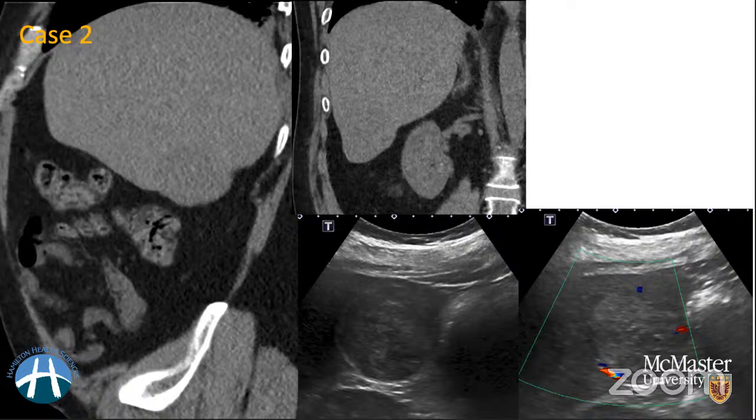And it is really important that you recommend the right next step to ensure that you have evaluated the abnormality correctly. So in this particular examination, we gave a bunch of differentials. We were not able to further characterize this based on this imaging. And the next right step to go forward is to perform multi-phase liver imaging, ideally with MR, but sometimes it may or may not be feasible depending on the resources which you have.